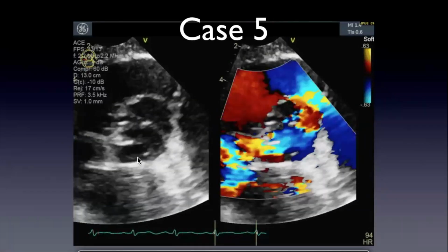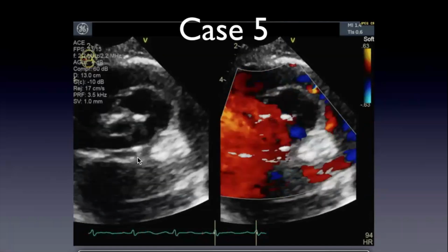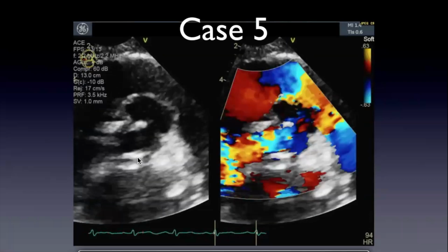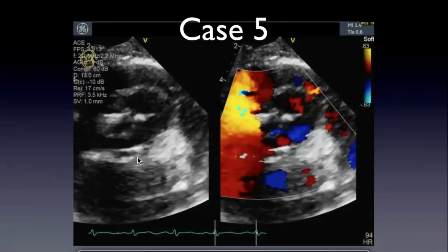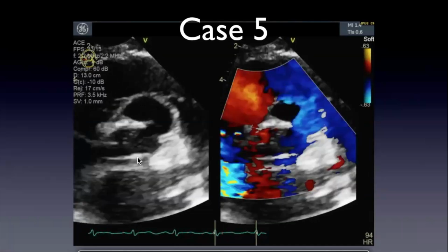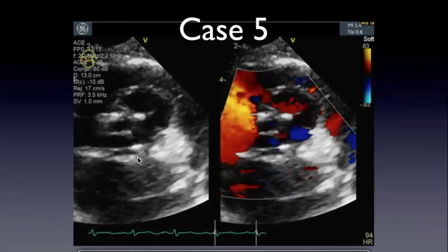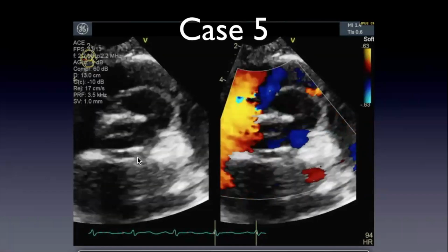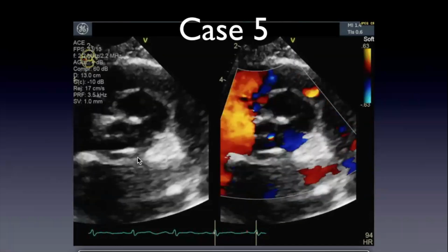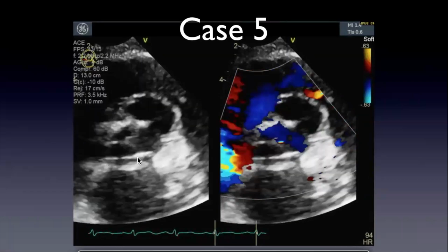So that's why it's useful to detect, for example, we talked about that case at M&M rounds. There are some nuances behind it, but it's useful to look at whether or not there's a leak from the chambers of the heart into the pericardial space by using ultrasound contrast. A number of studies have done that. We've done that here as well. But there are some nuances behind that, and the same here when you're not sure if this is attached to any of the chambers of the heart.